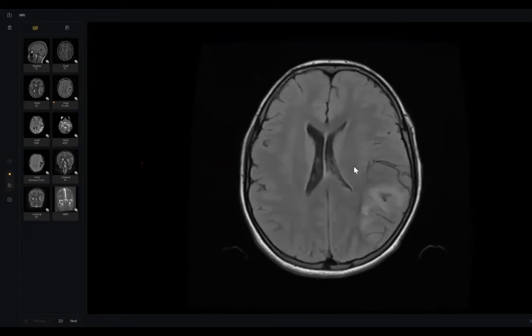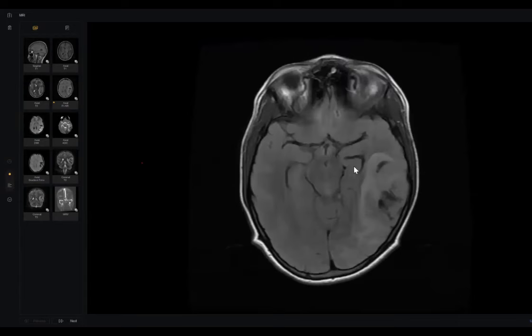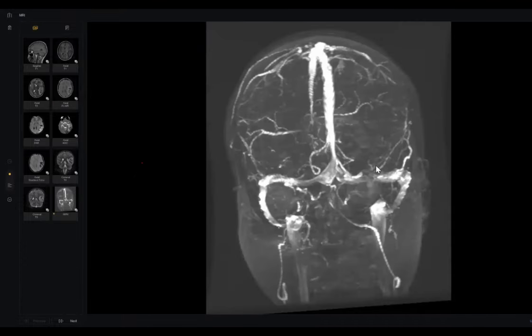This is hemorrhage, but I need to look. Another possibility, in a young child, could be a calcified AVM, a vascular malformation. Look here. What is the difference between here and here?